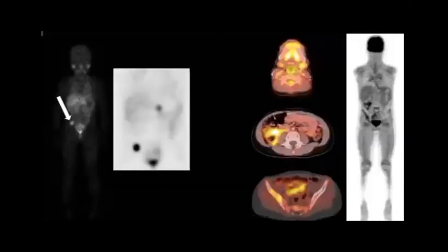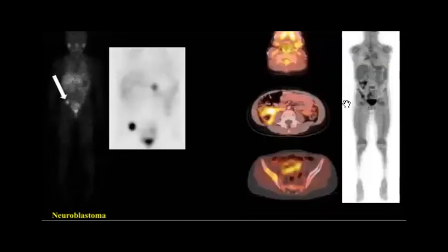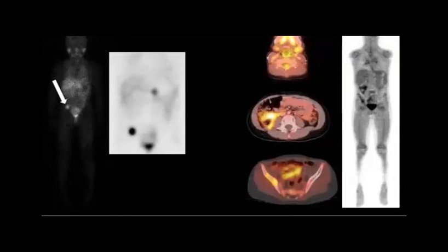Let's go to this patient, and I can tell you which will be the key. Let's go to this patient in this image first, which is the FDG PET-CT. I just moved a bit like this. Oops, okay, so I showed you the answer with my movement. How can you describe this?